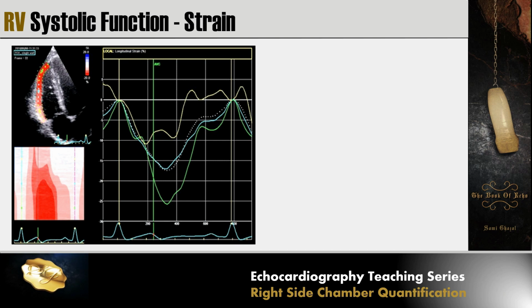Also, RV strain is feasible. We can always use the RV strain for more accurate RV systolic function. It's a bit time consuming, but it's still doable. Sometimes if the software does not have the package for the RV, we still can do it by utilizing the LV package. And then what we are interested in here is this RV free wall, because the septum was already taken in the LV evaluation.